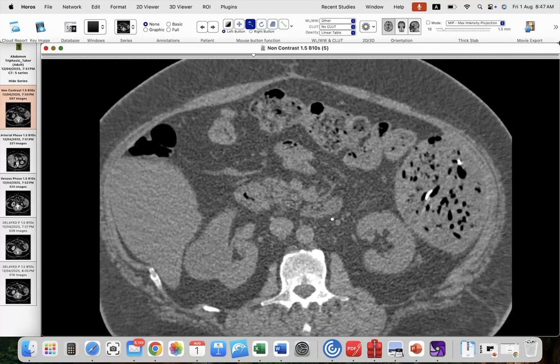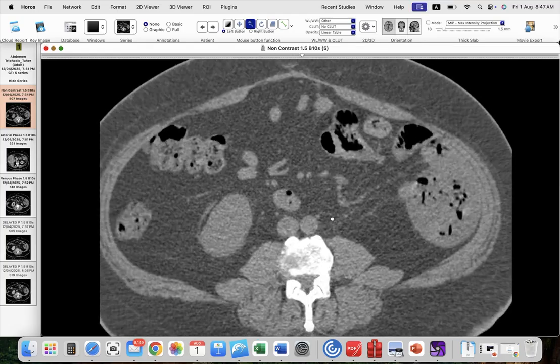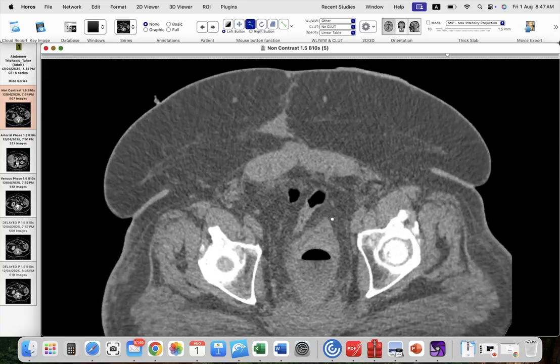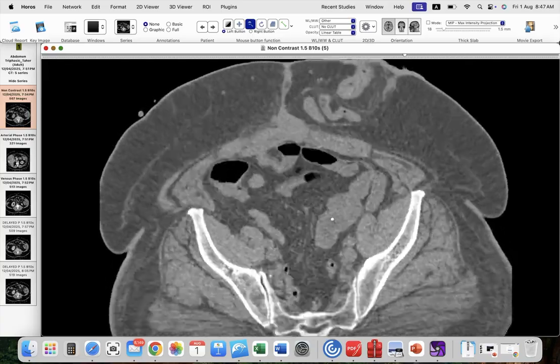Assalamu alaikum. This is a patient aged 50 years old. He had abdominal surgery 2 years ago to remove cancer. He did a rectosigmoidectomy. No previous imaging is available.